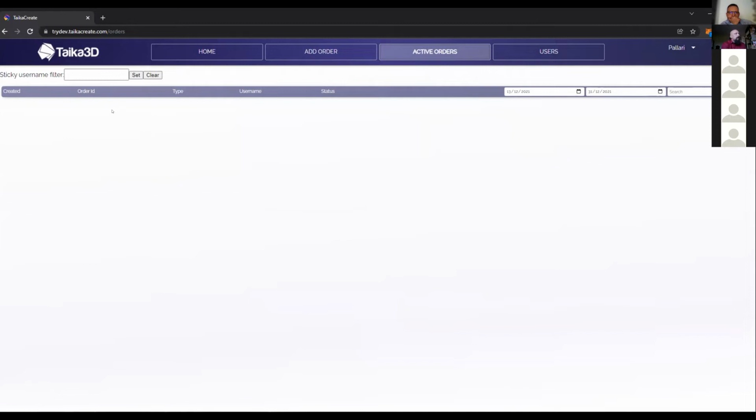And while it's uploading that, I can also start another upload. So this is now processing, and this is also your typical use case, because your clinicians would be out there in different hospitals seeing patients, and they would be sending orders, and they would then pop up on the server like this.